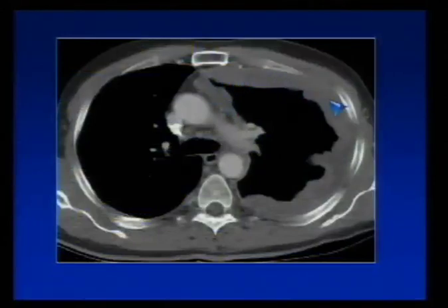How about this particular case? Look at the nodular thickening of the pleura. So this isn't a single mass, it's circumferential, could be mesothelioma, but that's not common. More commonly are metastases from what? Lung cancer, breast cancer, what else? Drop metastases from thymoma, GI tumors like gastric carcinoma, pancreatic carcinoma. And this could also be lymphoma or mesothelioma, as we discussed. So you don't have to mention all of them, mention a couple, say mesothelioma is a possibility, but more likely metastases such as lung cancer or breast cancer.